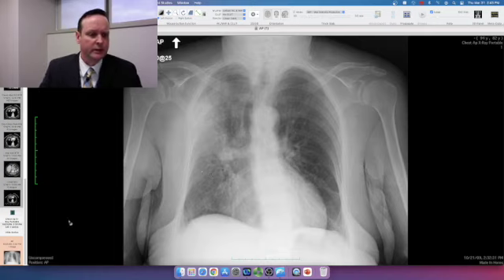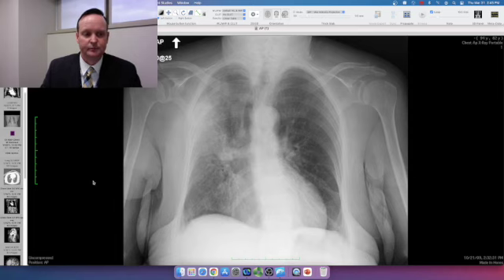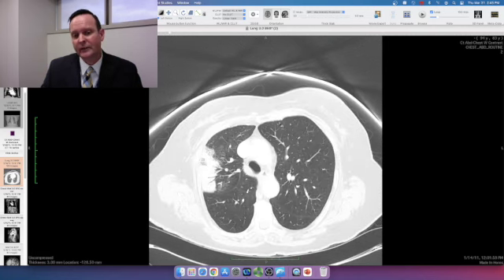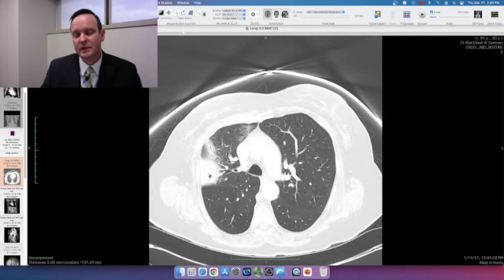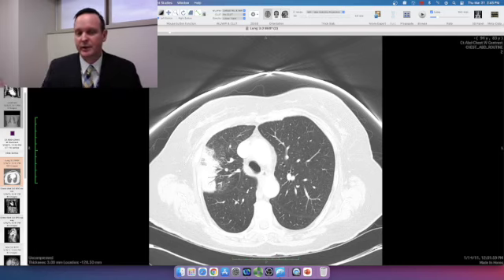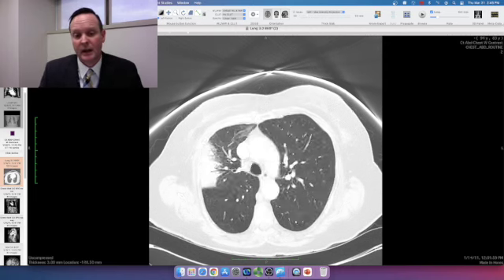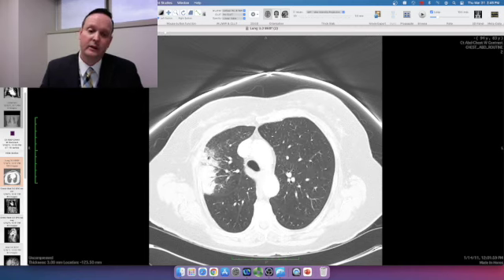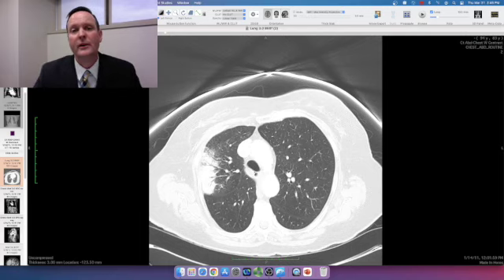But for this patient, who had this chest x-ray obtained in 2009, we have a follow-up chest CT from 2 years later. And here we've got a very similar look to this consolidation. And this is just a sampling of this patient's multiple studies from the chest x-ray throughout their care. And the point here is that this is a chronic consolidation. It has air bronchograms, it has all the characteristics of a consolidation, but it didn't go away. So after 6 weeks, a consolidation is then considered chronic.